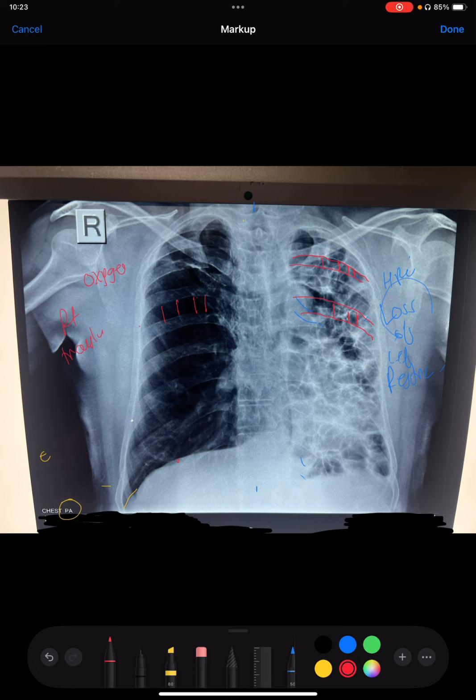So this is a very interesting X-ray, and I will share the CT scan of the same patient, which shows very good chronic cystic bronchiectasis with significant restrictive lung disease with mediastinal as well as tracheal shifting to the left side. Why mediastinal? Because we can see some portion of the heart, especially some right atrium, right ventricle should have been here, but this is all the vertebral spine.